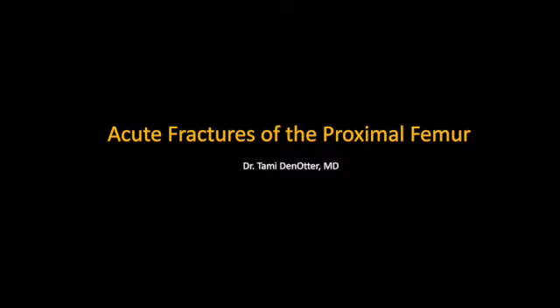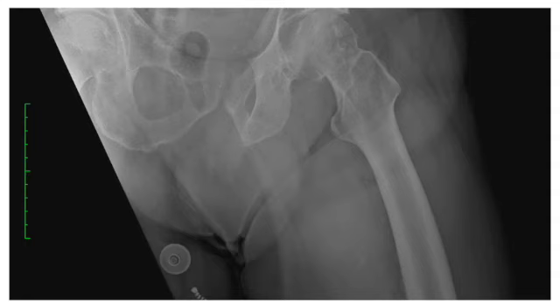Today's mini lecture will be on acute fractures of the proximal femur and the radiographic workup of acute hip pain. Let's get started. Our first radiograph is a frontal radiograph of the left hip in a patient with acute left hip pain. What do you see?